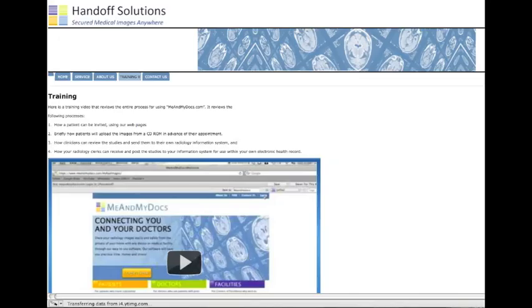So that's how to use the Me and My Docs application. All this material is available online at our corporate website, handoffsolutions.com. And there are 2 training videos. They're very similar. One goes into a little bit more detail as an overview of what the radiology clerk does as well, if you're interested in that.